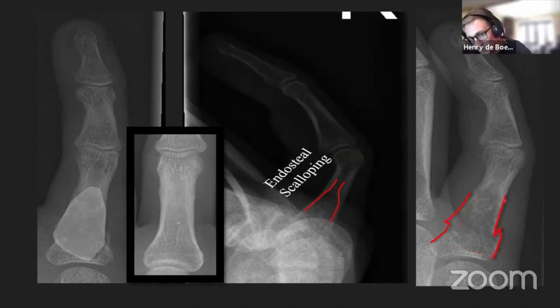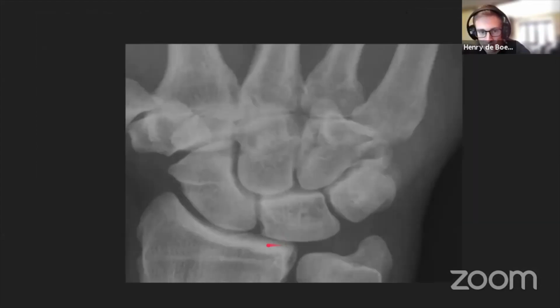Spotting the bone lesion is important, but that I think is where your limits sort of lie. Pathological fracture, so fracture through a bone lesion, and then leave it for orthopedics and radiology to work out what the bone lesion is. So yeah, pathological fracture. Next case.